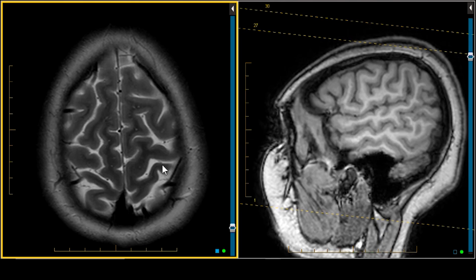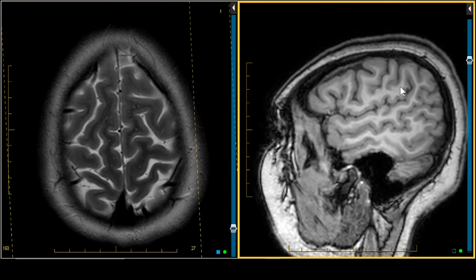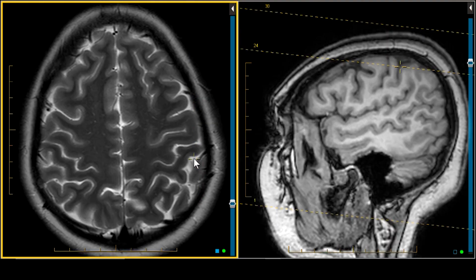If you are a disbeliever or skeptical, we spent many vignettes isolating the central sulcus of Rolando in the sagittal projection. There it is, and it is consistent with our model. There's our precentral sulcus, there's our central sulcus. You can see they cross-reference very nicely. Isolating the superior frontal sulcus, following into the precentral sulcus, allows you to locate the central sulcus of Rolando.